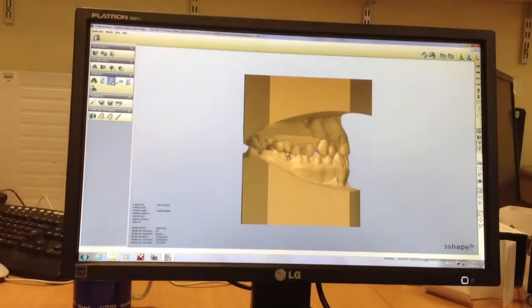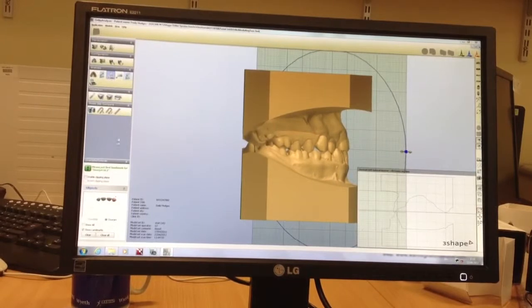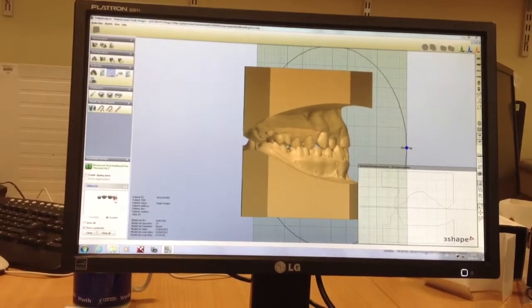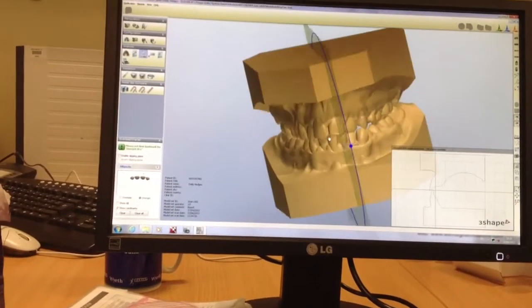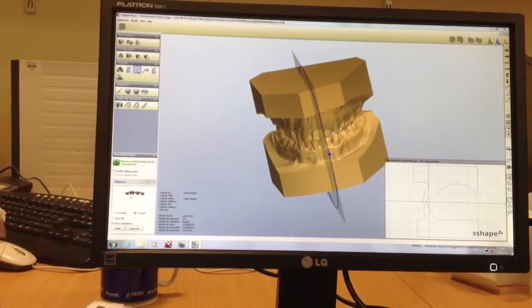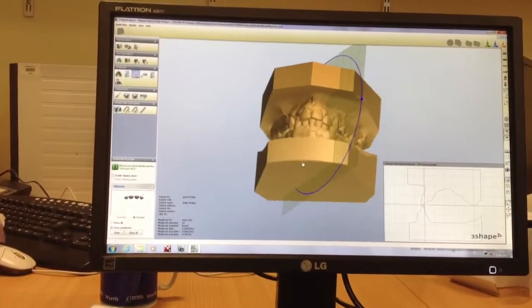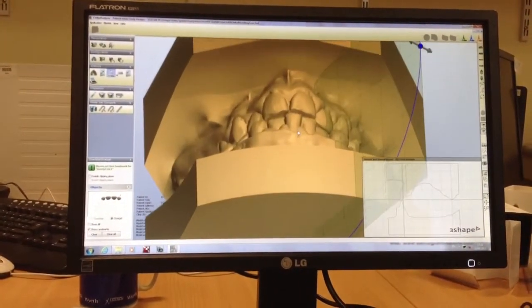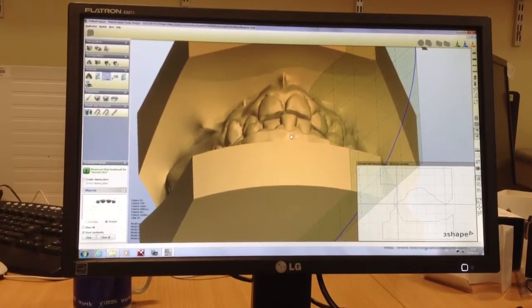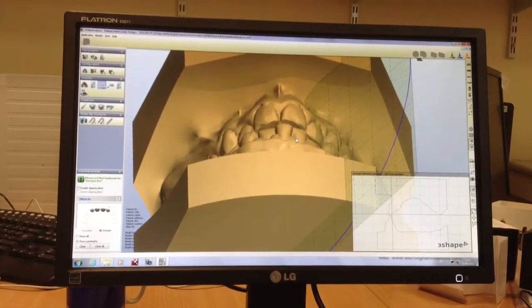The next step is to go into overjet and overbite, this icon here in the middle of analysis. What we're presented with then is the 4 incisors. This is based on the ABO standard, which requires that you measure the overjet and overbite at each of the 4 incisors. But we don't need to go that far. What I tend to do is look at the model from the front, tilt it backwards, and try to figure out, if we were placing a ruler in here, where would the ruler stop and where would we take a reading from? It's the best way to move from manual PAR scoring to digital PAR scoring.